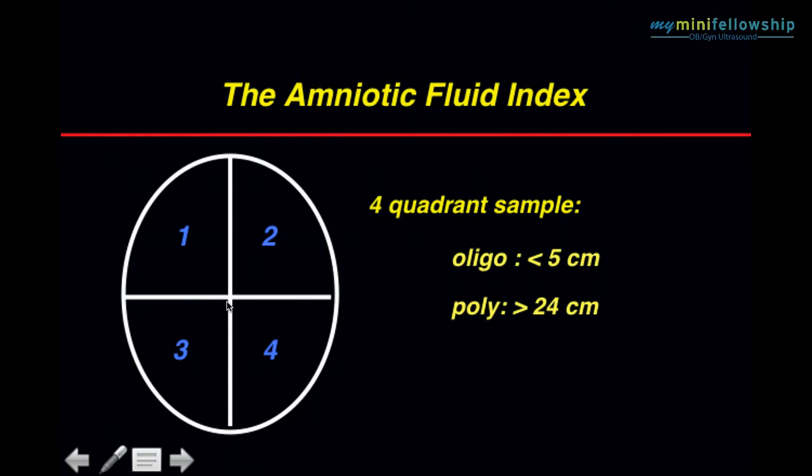Now, the thing that really bothers me about it is that while you may never have thought of it quite that way, intuitively, every sonographer understands that that doesn't make any sense whatsoever. To basically measure the same pocket 4 times 2 millimeters apart. It's ridiculous. And the knowing of how ludicrous that is drives all the measurements out to the periphery, which is no more logical than measuring them all right here.